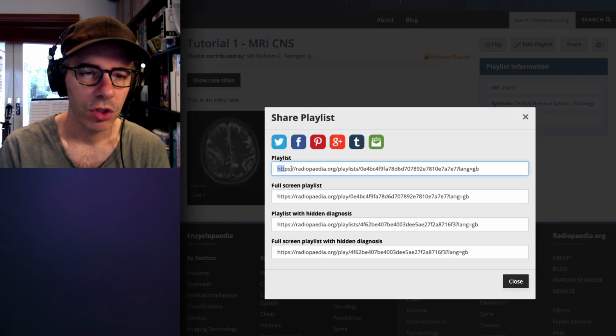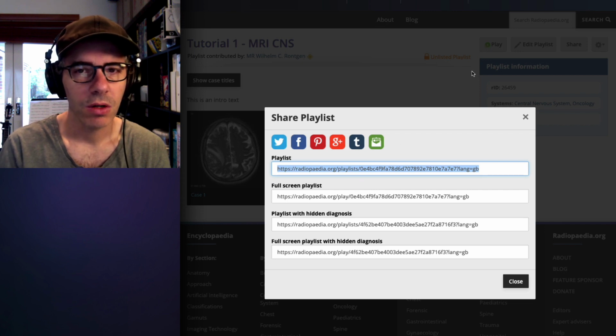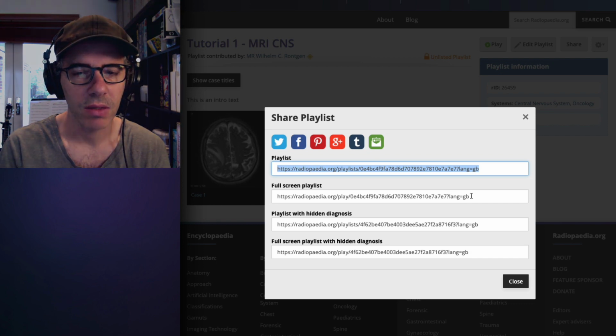If you share this URL, you will get the view here behind. The user will be taken to this view, and then they can click play. This is good if you've got a lot of cases and you want people to not do them in order, but ideally I would share it in full screen playlist mode.